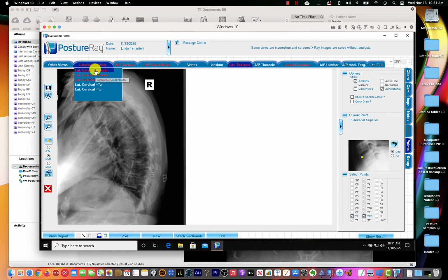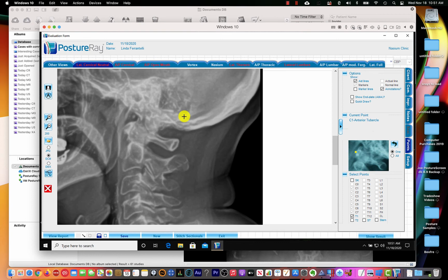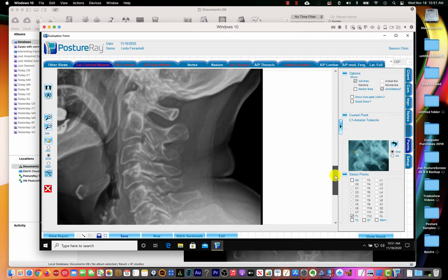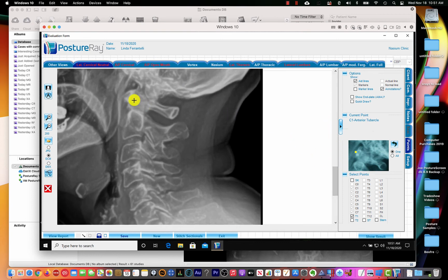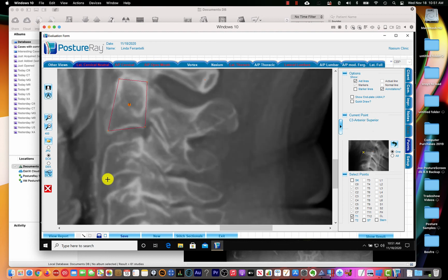With that being said, let's go ahead and get started on just a lateral cervical. So we have training videos specific on this in detail. I'm just going to go through real quick on this one. I will blow this up a little bit more so you can see it in the training video. Okay. And normally when I'm digitizing too, I'm just using a mouse here. And as you can see, you can be pretty proficient with a mouse pad.